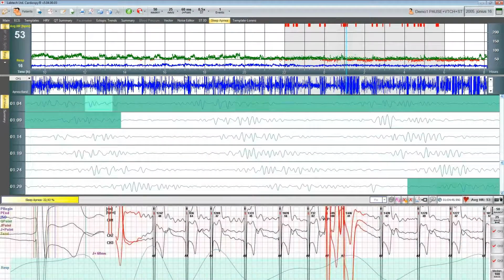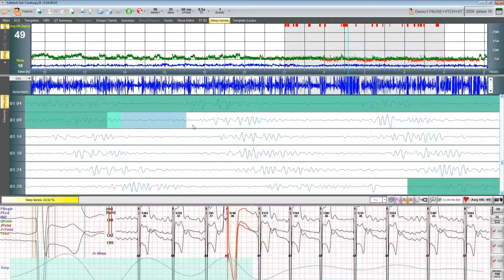I'm not sure how familiar you are with sleep apnea, but with this function it's very easy to detect it, because sleep apnea is the lack of breathing. Then the patient starts to breathe very frequently and very hard when he's sleeping, and it's called sleep apnea because you can only detect this event when the patient sleeps.